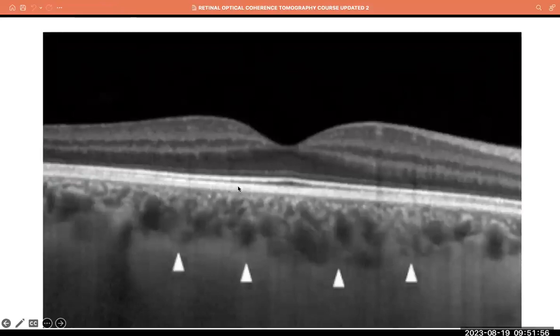Okay, that's just it. But look at the white lines. There are 4 of them. The faintest among them is the one most inward, meaning the one that is topmost among them in the outer retina. Dr. Bature, please, can you move your cursor? Yes, that's the one I'm describing. This is the external limiting membrane, ELM.